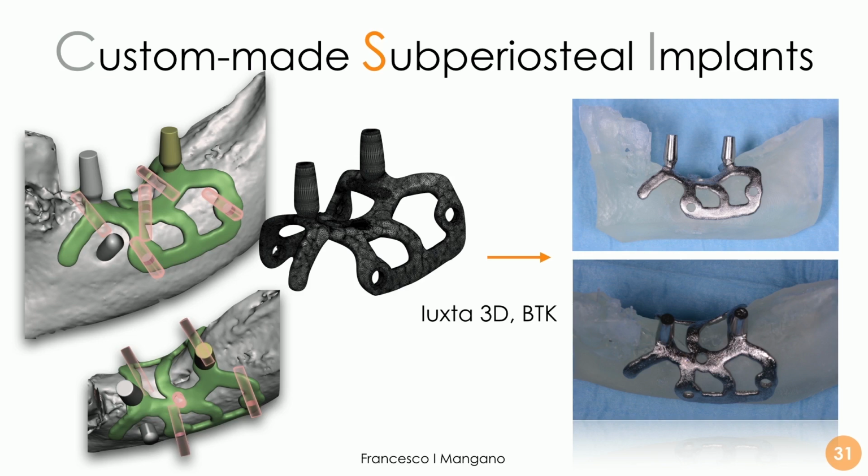And this is the aspect of the subperiosteal implants. As we can see with the integral abutment, these implants are printed in titanium before being delivered to the clinician for use in surgery. They are checked scrupulously and carefully on a 3D printed model of the bone, once again coming from a segmentation from cone beam computed tomography.